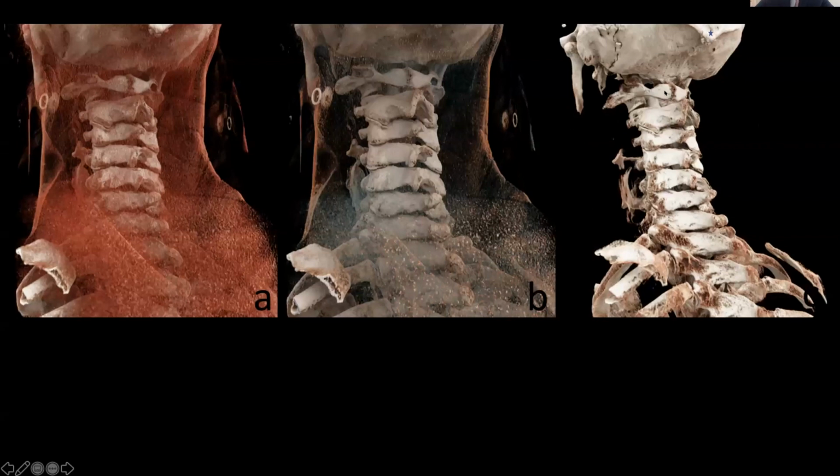Again, getting back to being sure that you've actually rendered it in the correct way, that it's not a fabrication. The interlaminar space between the lamina, being able to see that really well to place a needle or to plan, for example, placing an endoscope. Those of you who may be interested in endoscopic spine surgery. And then, of course, your facet joints and the orientation of the facet joints from various angles.